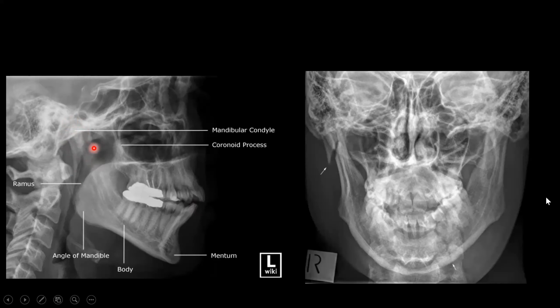And then you go like this. So I will start from here. You can see, this is the coronoid process. This coronoid process, you will rarely see any fracture. Up till now, I've seen maybe a couple of fractures, but most of the fractures I've seen here. Okay, so this is very important. You must know all this.